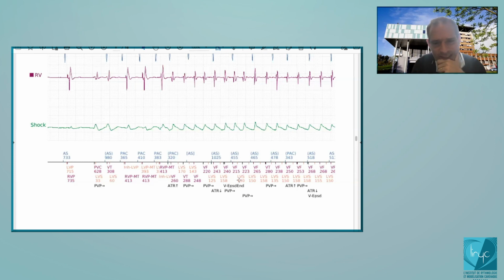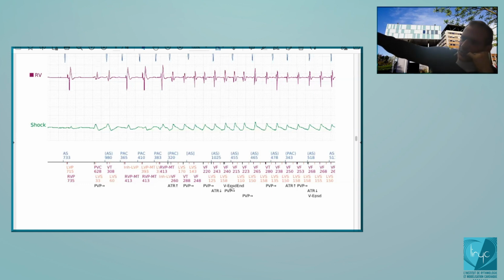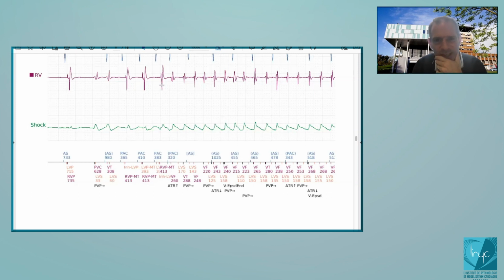And you see that this is here, this marker. Most of the time you don't see the marker on the tracing because after the shock, you will not see the 10 additional seconds after the shock. So you don't see this marker. Here you see the marker at this time from the delivery of the shock, which defines, yes, exactly. Between the end of the shock and this, there are 10 seconds. So at this time, this is now the end of the episode because you have not encountered the 8 out of 10. And then you will restart to 0. Now the next therapy will be the first one.